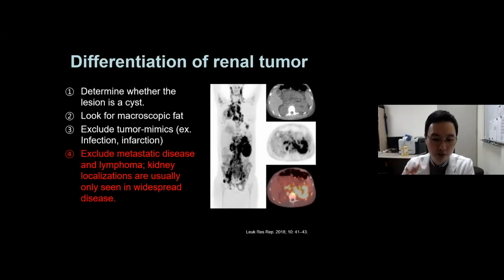If there is absence of renal vein thrombosis, or absence of obstruction in the pelvicalyceal system, these may indicate a lymphoma rather than renal cell carcinoma, since renal cell carcinomas can actually have a mass effect in the renal calyceal system, or pericalyceal system, or may have calcification or renal vein thrombus.